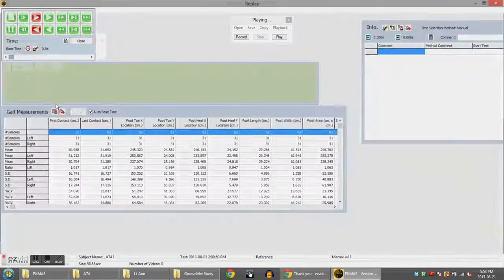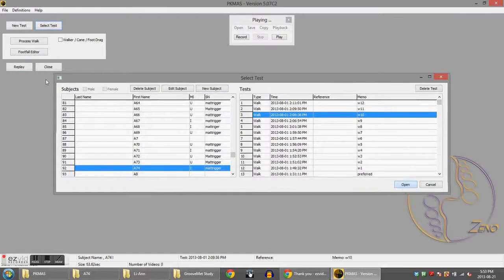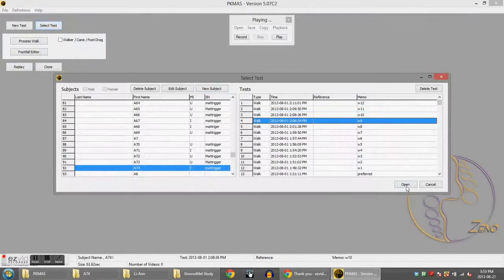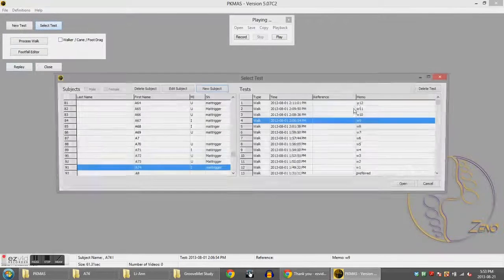individually for each row. This only works if you have this exact number of rows, so 13 rows. If you have more rows, you'd have to record another mouse recording script.